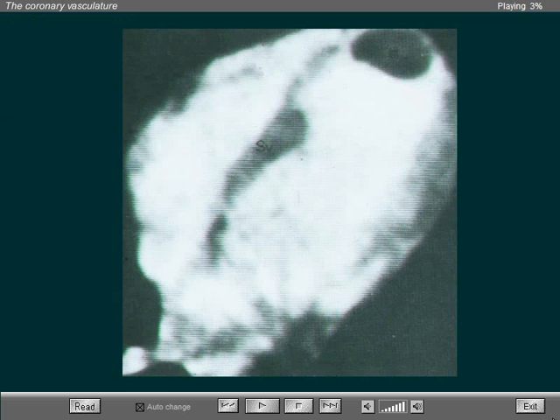In addition to left ventricular aneurysms, thrombi can develop in the aneurysmal cavity, as illustrated in this CT study. The filling defect is noted in the periapical region. These masses can embolize, and systemic arterial occlusions can occur as a result of free-floating thrombi inside the aneurysmal cavity.